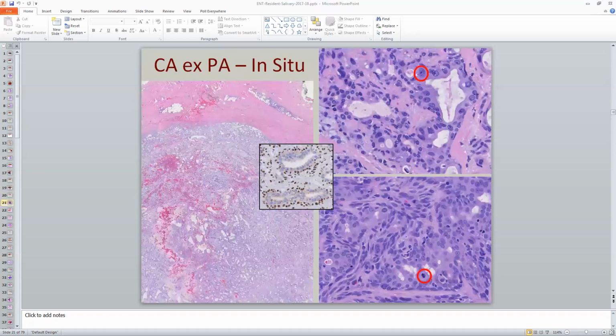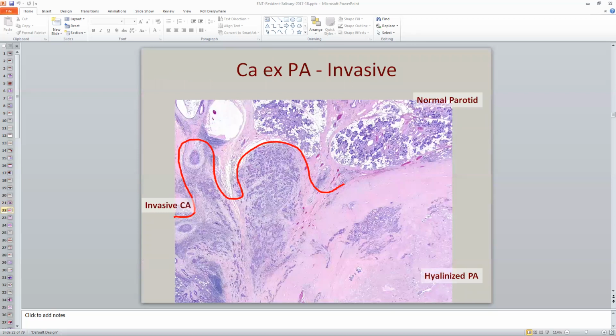And then carcinoma ex looks like it starts as a proliferation of the epithelial cells within the ducts. Now we actually get pleomorphism, we get nuclear atypia with prominent nucleoli, mitoses. Then this component ends up essentially invading and breaking out of the original boundaries of the tumor and invading into the adjacent stroma. And so here is your pre-existing, benign pleomorphic adenoma component that is this sort of vague nodule, and then bam, you have these sort of tongues of invasive carcinoma.